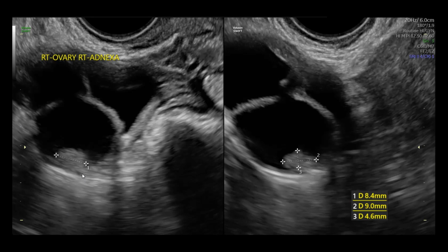I can also help you understand that if we look nearby, we might be seeing what an acoustic shadow is to be able to compare against. Things are often relative with ultrasound. So we have a bit of edge artifact here producing an acoustic shadow in this exact region right here, and that same region right here. Should this acoustic shadow have appeared here, then I would have described this as having an acoustic shadow. And that is a really important metric for the ADNEX model.